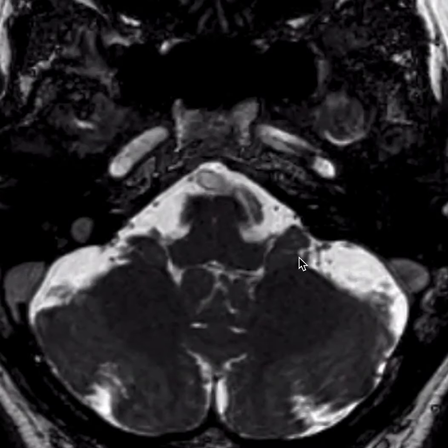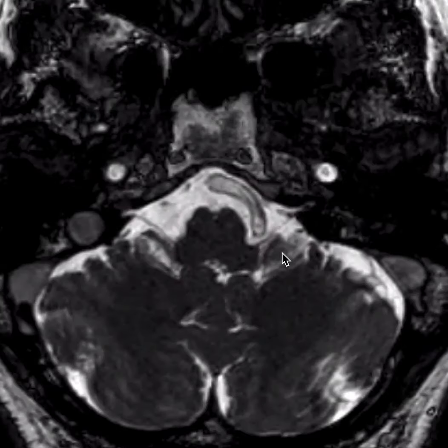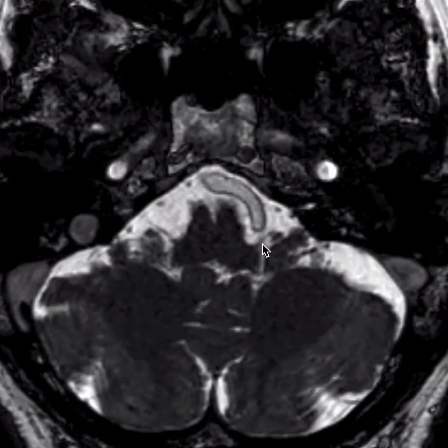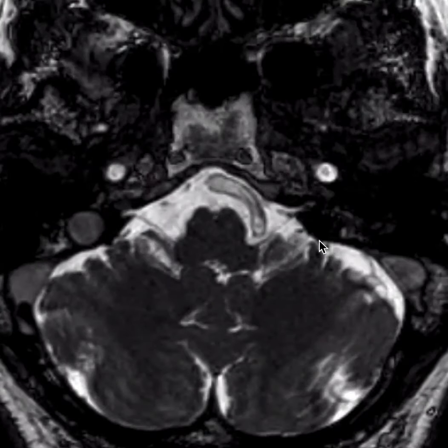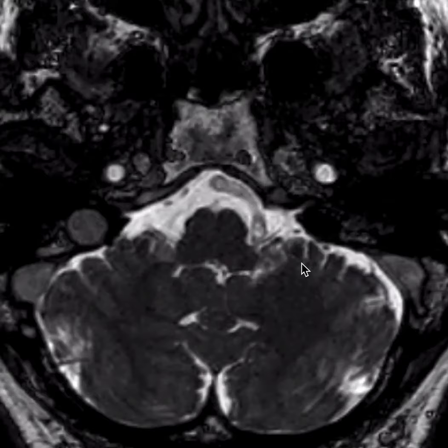As we scroll more inferiorly, we'll notice the jugular foramen right here. It is through this that the glossopharyngeal, vagus, and accessory nerves will course. The glossopharyngeal nerve is the most anterior and superior of these nerves and is going to course right here through its cisternal segment to enter the jugular foramen. As I get a little more inferiorly, we'll see the branches of the vagus nerve come off the posterolateral sulcus, and they will likewise enter the jugular foramen.